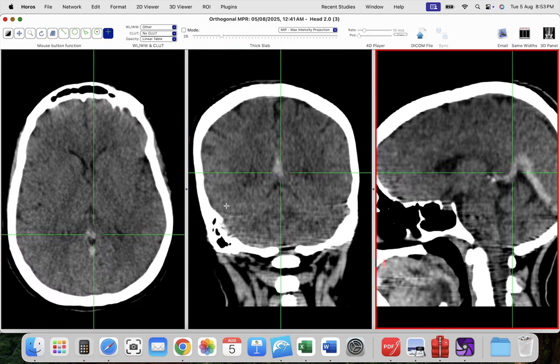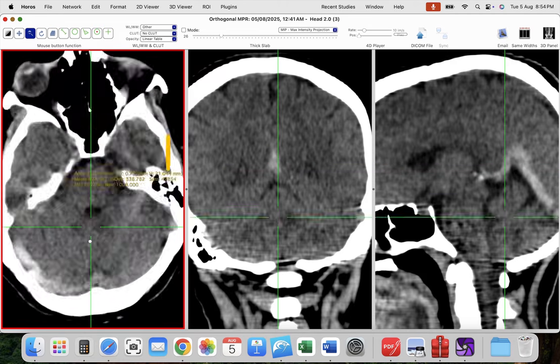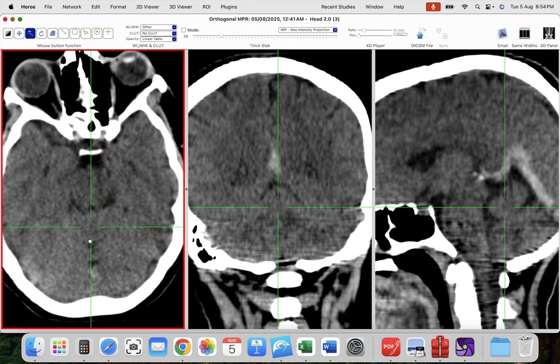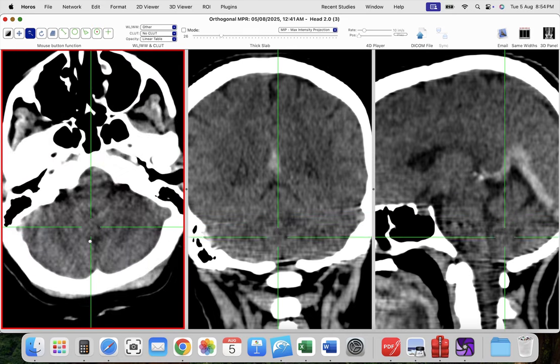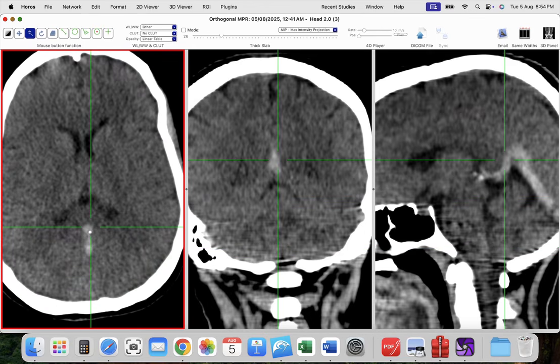This is matching with thrombosis, as we know that the thrombus is hyperdense, or slightly white, on the non-contrast CT. The cause of the hyperdensity is the coagulation process that occurs inside the thrombus, with calcium deposition inside the thrombus, as well as proteinaceous material. All those factors increase the density of the thrombus, which helps us to diagnose the presence of thrombosis inside the vein without the need of injecting any contrast material.